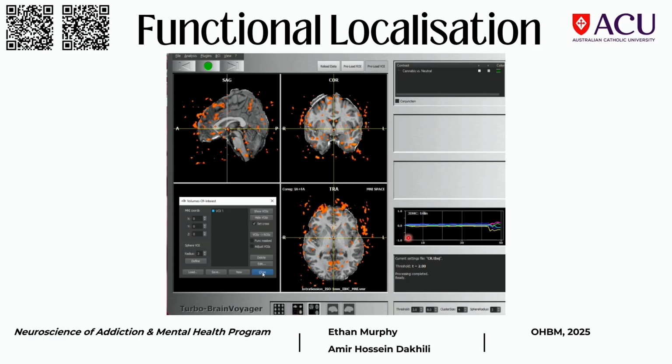This is tough. Anyone, any guess? A hint is it's with the volume of interest box. So there's something that we haven't done inside that box. Do you want to maybe? Yeah. Something around here.